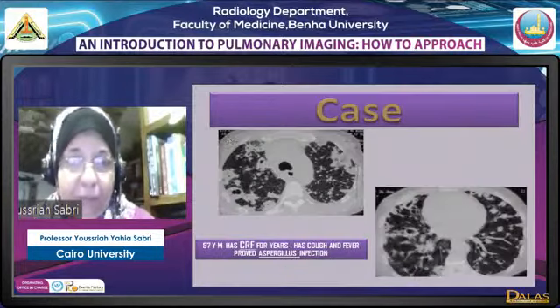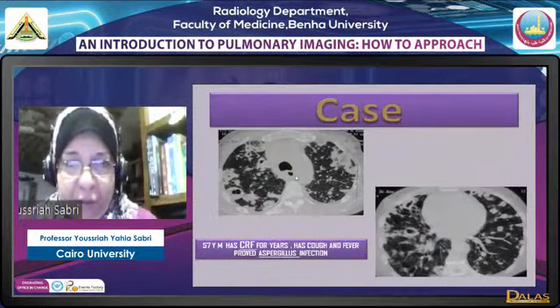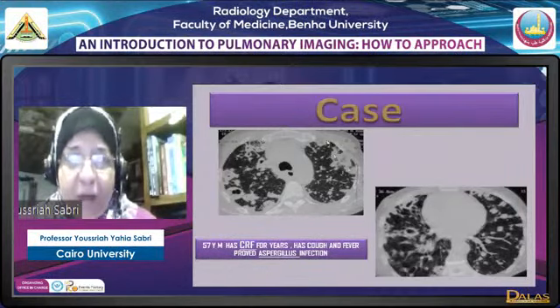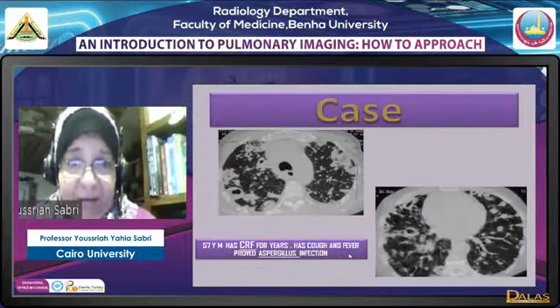Actually, we had the history, female 9 years old with neglected inflamed fracture, and these are pyemic abscesses. In this case, this was a male patient with chronic renal failure, and we find bilateral multiple nodular opacities, as you can see, with cavitation. Some of them are rather bizarre in appearance. We considered infection or atypical infection, and it was a proved case of Aspergillus fumigatus infection.